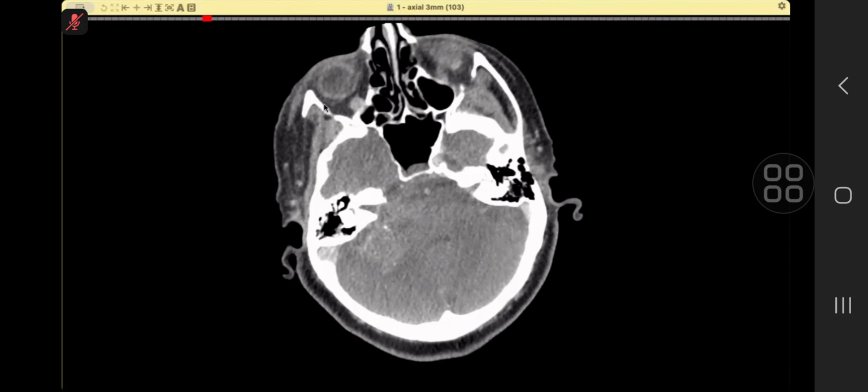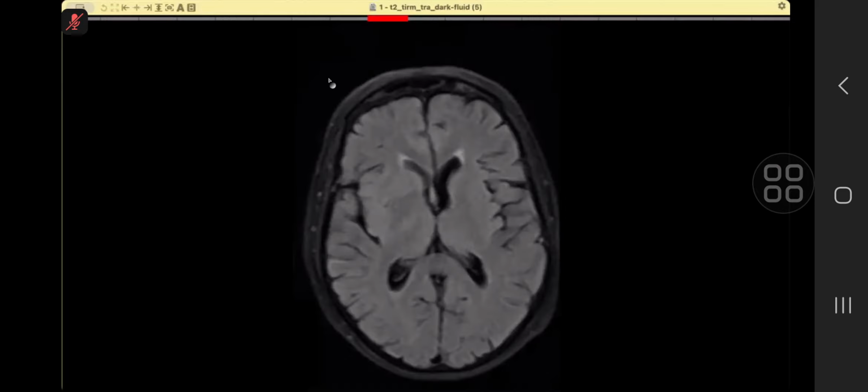Tell me your diagnosis. Sir, on the findings along the right parasagittal location, with calcifications, an aggressive lesion, it could be chondrosarcoma. Other differentials in this case would be metastasis. Chordoma is less likely because this is off the midline. Other less likely differentials could be some neurogenic tumors like schwannoma.